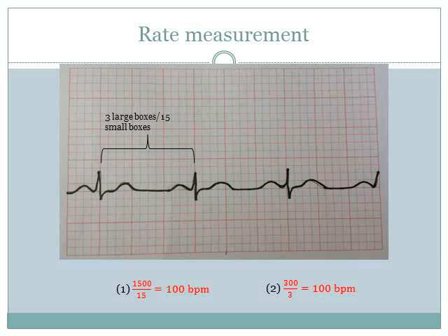When I drew this ECG strip, I made it easier, but when you have to calculate the heart rate in real strips, it would be harder. Now you see how to do it, and you can practice this method using different ECG strips. Again, the most accurate method is the 1500 method, and the third method is by using the series of numbers I said.